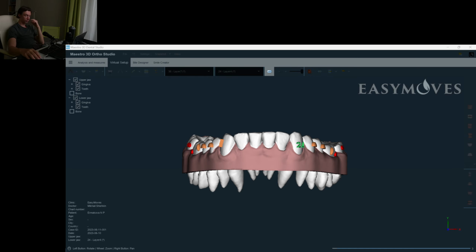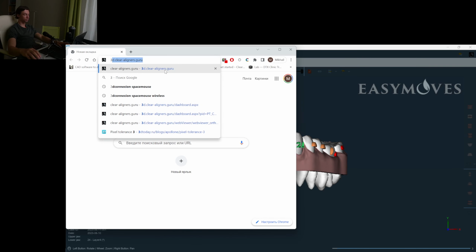We're uploading it to the cloud, opening the browser.